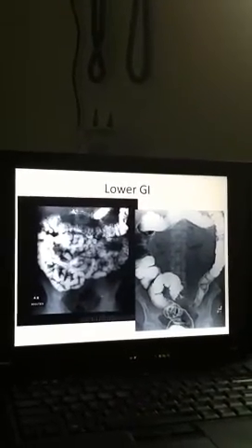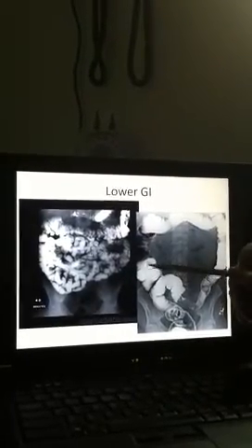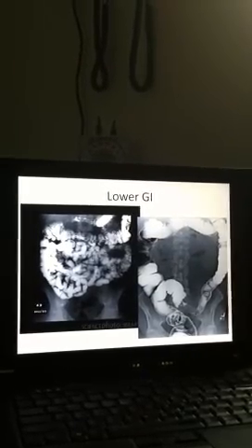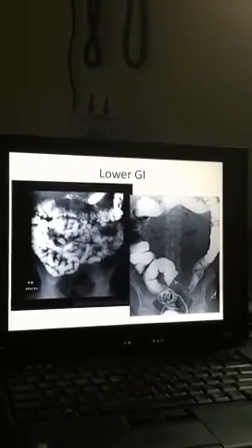Are the color differences the same thing? They're just moving funny because there's a spot of really black there. That just means that the dye got pooled here, and then it continued, but then this part moved on. The dye does funny stuff. It's not that the colon is dead or something. No. You can still see the outline of the colon, so.